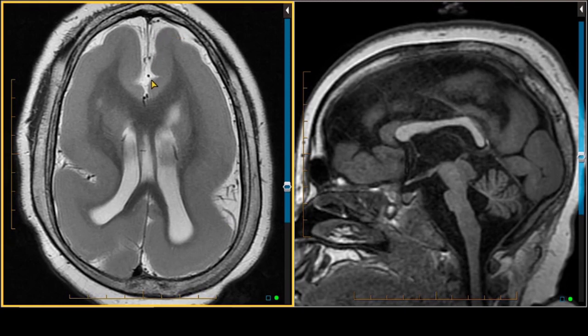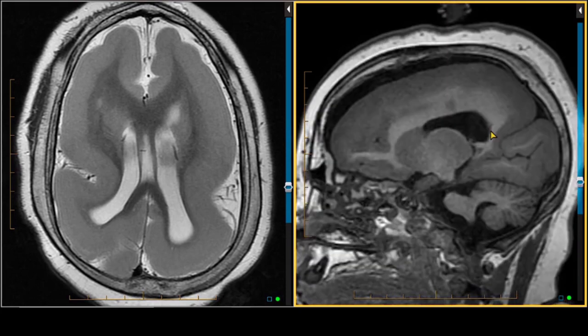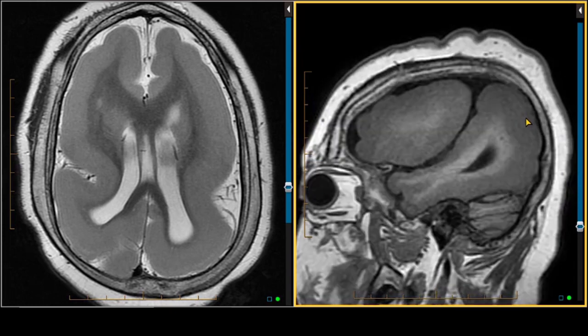In this parasagittal aspect of the frontal lobes, we see the anterior aspect of the cingulate gyrus. If we go here to the sagittal image, we see the parieto-occipital fissure, we see the calcarine sulcus, but otherwise, we're seeing very few sulcations within the cuneus of the occipital lobe, as well as the lingual gyrus of the occipital lobe. If we go a little bit off to the side, we're also seeing minimal sulcation, very featureless brain.